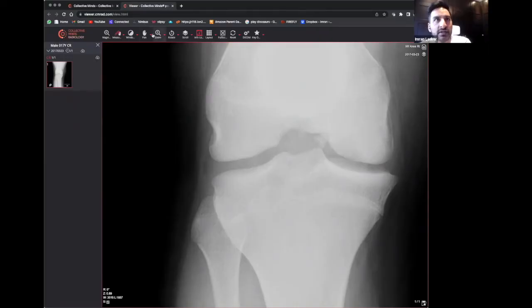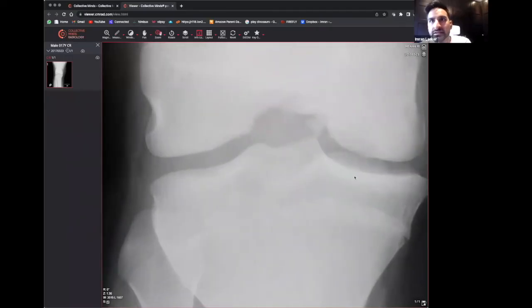Now, I can't convincingly say I can see one, but you may identify an osteochondral defect. But actually, let's zoom in a bit. And there is a sort of radiolucent area over here. Right, which brings us on to what someone has mentioned. Someone has said there could be a loose body located within the joint. Hopefully everyone can see that. Can everyone see that? So I'm going to get that pen out. Can you see this little loose body that's sitting over here? So you've got what looks like a loose body sitting within the knee joint itself.